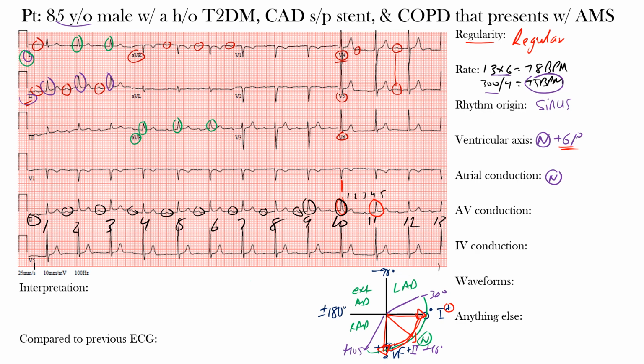So this suggests an AV block is present, okay? And more specifically, we have a first-degree AV block because there's no evidence of any dropped beats that we saw. Remember, there's always a P wave for a QRS complex, no dropped beats, and there's no change in the PR interval that we'll see here, okay?